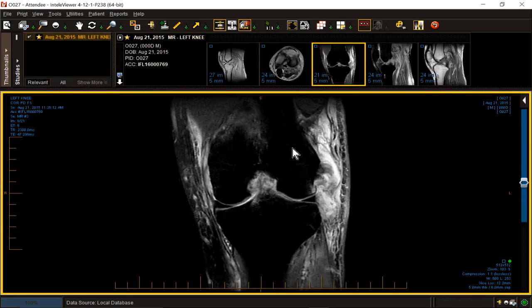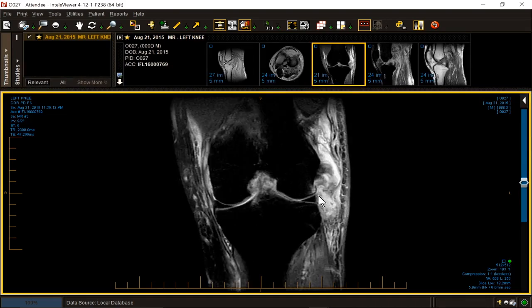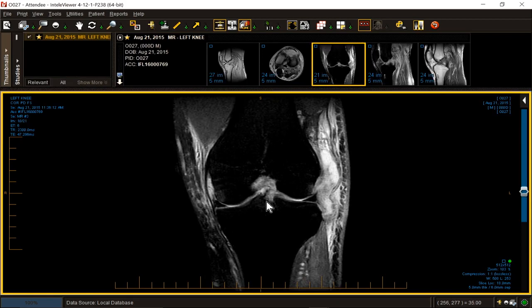We again reaffirm the integrity of our menisci, but what about our meniscocapsular attachments? The attachments laterally, not so good. Now they're easier to see posterior, but there should be some band attaching the lateral meniscus to the femur and one to the tibia. Those are gone.